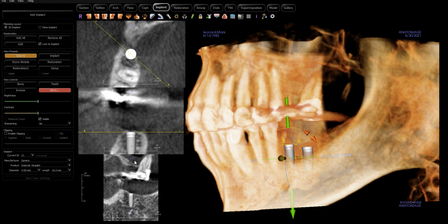I kind of just skip it and I say if I have opposing occlusion, the opposing occlusion is what's going to dictate the tooth. Why put a tooth in? If I know what the end is, then I can just skip the whole wax up part. With that said, there are many times it's super helpful to use that tool. So let's get good together at using that restoration tab. I'm going to look for a case that has a ridge deficiency so that we can have a better discussion about when to graft, but I think you get the idea.